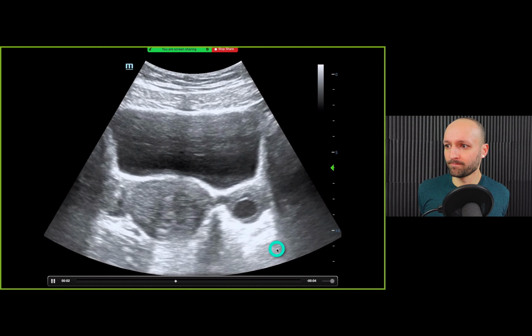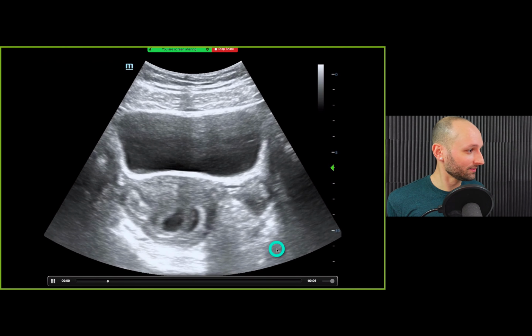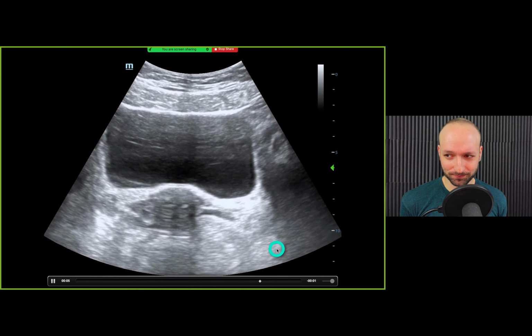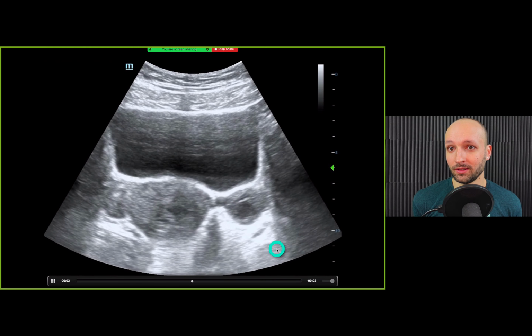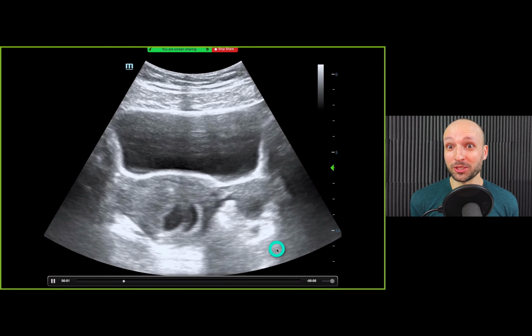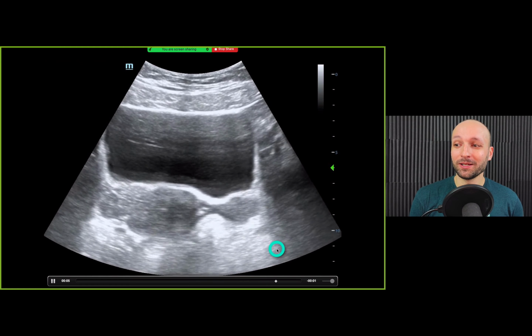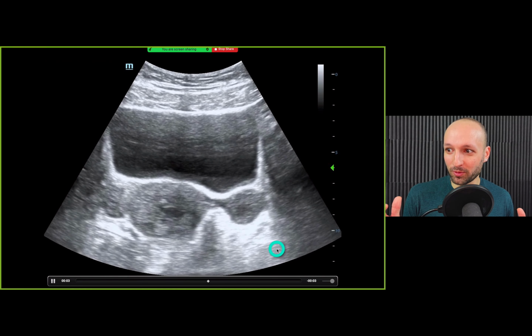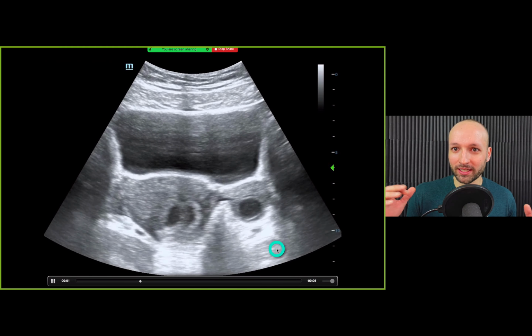Any thoughts? A cyst and a pregnancy? Okay, a cyst and a pregnancy. That's brilliant. Wilson's kind of on it. Now, what if I told you, Wilson, that this patient is on Clomid, which is a fertility drug? Yeah, so this you have to be really careful with, because you're totally right, Wilson. This is an ovarian cyst with a perfectly normal early intrauterine pregnancy.